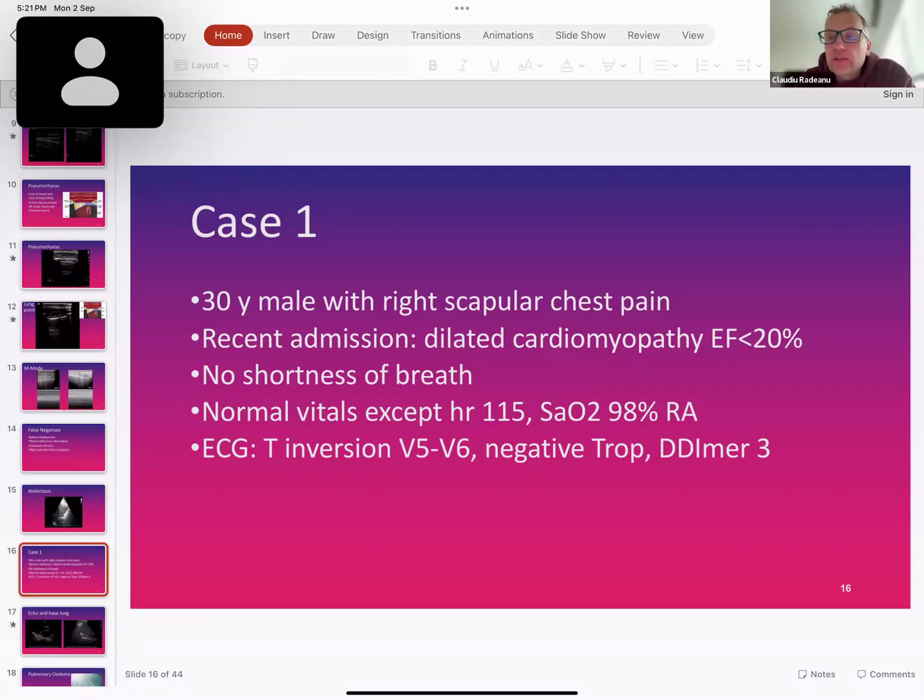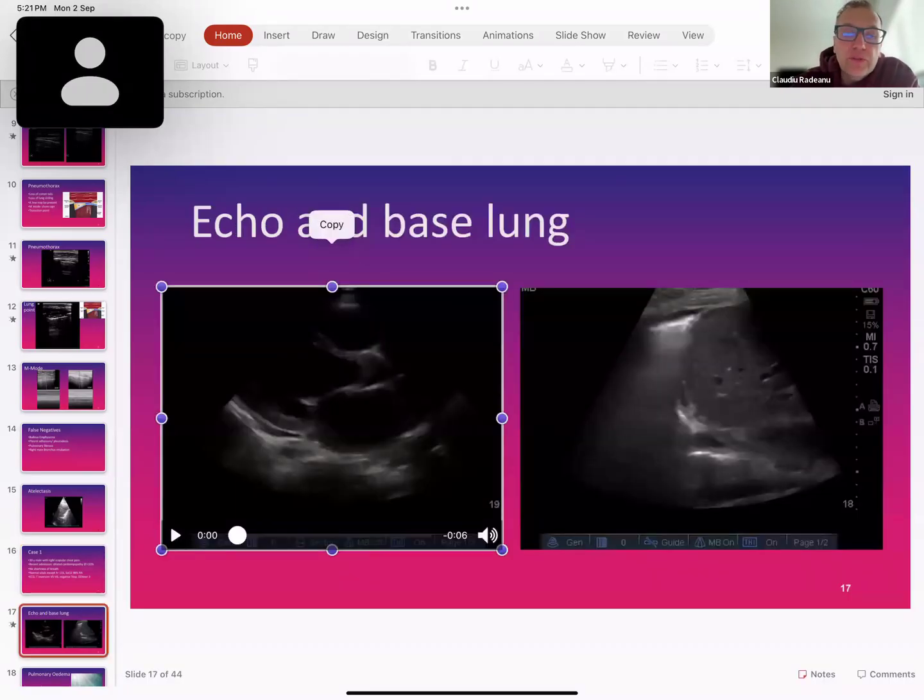Now, I'm not sure if you use D-dimer. In Australia, it's used, for example, as a screening tool for pulmonary embolism. So someone thought this gentleman had pulmonary embolism and therefore did a D-dimer, which is 3, very high and very abnormal. Again, D-dimer is not a great diagnostic test; it's more of an exclusion workup for blood clot. But if someone has a D-dimer of 3, it can be anything. So let's have a look at the images and see what comes out.